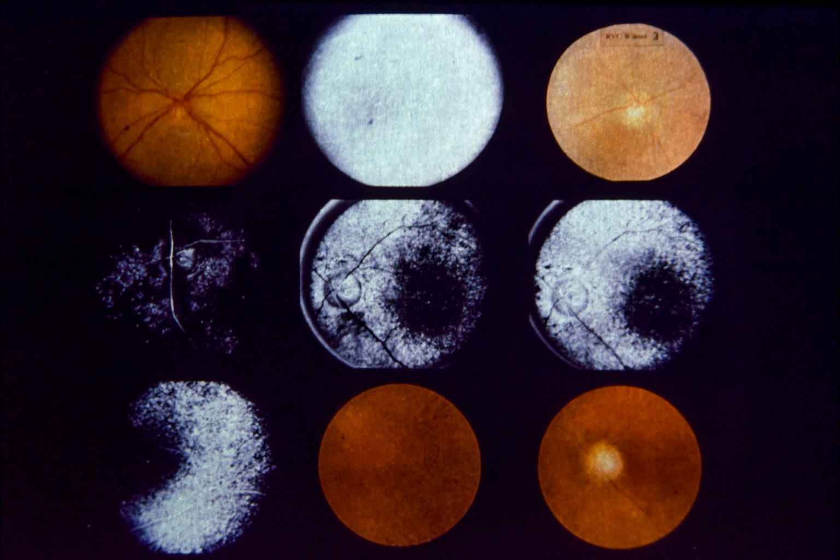The 3 fluorescein frames in the central row, which were taken at 9 seconds left, 12 seconds center, and 15 seconds right, show patchy filling of choriocapillaris and considerable mottling of pigment epithelium. Note that flow velocity in the retinal circulation is slow. Lower left, temporal to the macula, note increased background choroidal fluorescence due to pigment epithelial mottling.